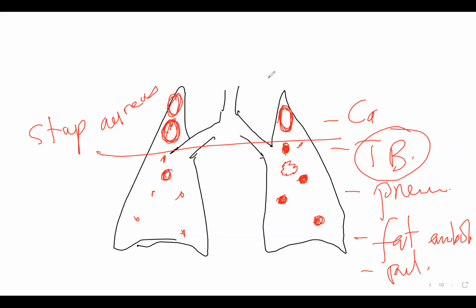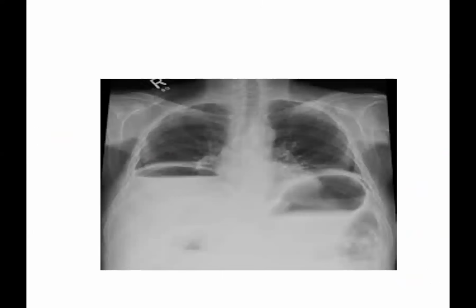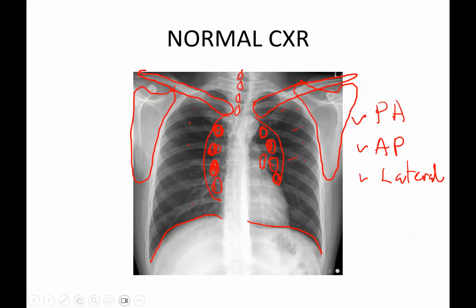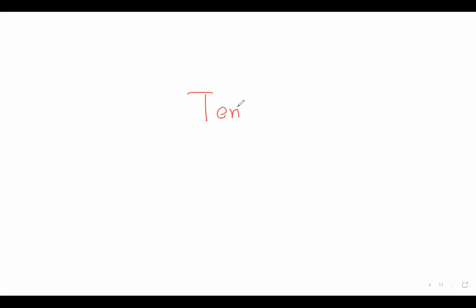Okay. Now we've talked a lot about X-rays as well as the different conditions that you see, the various types of pathology. Now, before we proceed to see all these conditions on this X-ray, let's also briefly talk about an important pathology you hardly escape in your exams. This is tension pneumothorax.